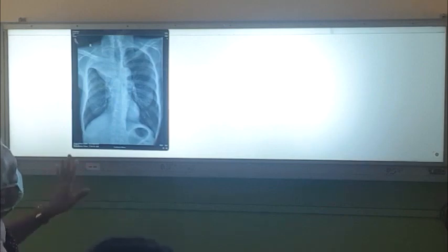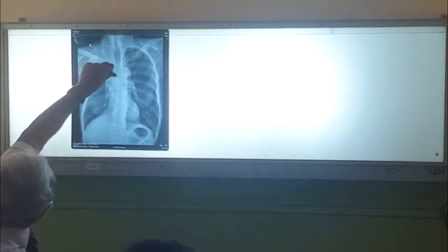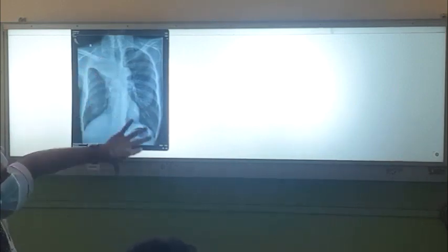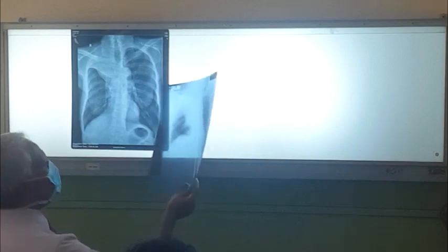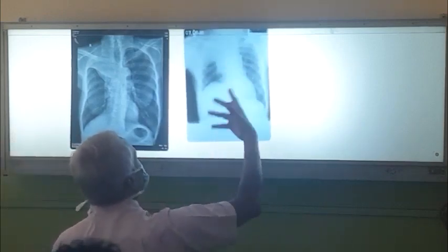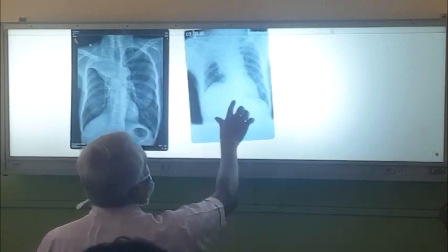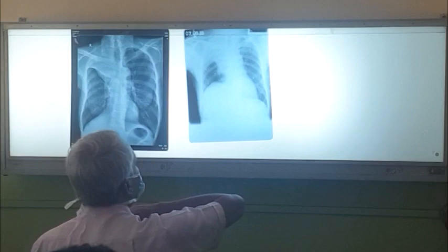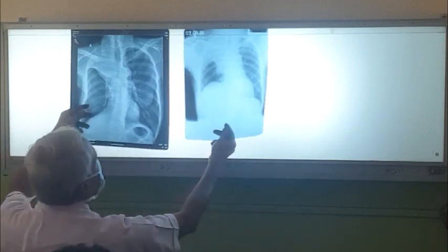Okay. And in these patients, as a habit, we look inside the trachea also. Sometimes when you look inside the trachea, you can see a mass inside the trachea, right? So this is again a very poor quality X-ray, underexposed, you can't see anything. There is an elevated diaphragm, volume impairment, and again right upper lobe collapse is there.